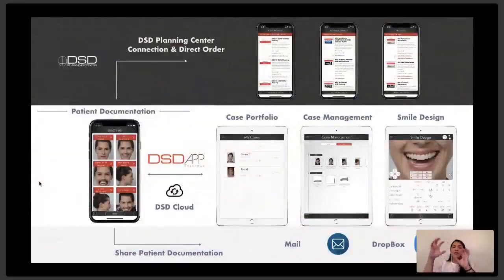So this is just the workflow of the app and how it's going to be managed. First we have the patient documentation. With the patient documentation, we're going to have in the app the option of creating the case portfolio, managing your cases, and creating your own smile design. You can also send that patient documentation straight to your lab to use it, if you don't want to create your smile design right away.